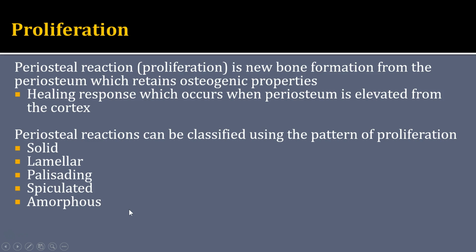So very young periosteal reactions will be very faint and very difficult to distinguish from soft tissue, whereas older or more chronic reactions will be more dense and bone-like. We can also try to think about if the disorder is active based on what the periosteal reaction looks like. Inactive reactions are very distinct with their margins, whereas an active reaction may have a more indistinct or fuzzy appearance on radiographs.